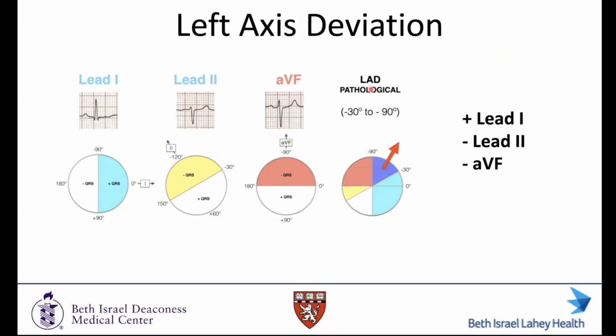Now, technically, you don't really need to use AVF. You can figure this out by lead 1 and lead 2, but we'll get into a little bit later when AVF can be helpful. It's included here also for completeness sake if you prefer AVF.